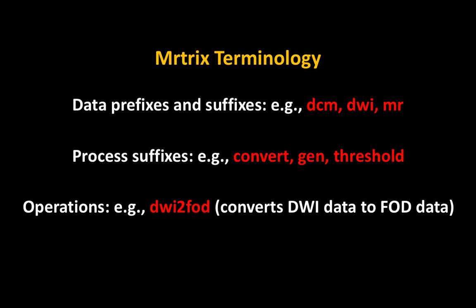You know the answer to run? Okay, that's fine. It converts MR data to another format. So typically, if you had something in NIfTI format, hey, that's the name of our organization. I just realized that. If you had something in neuroimaging, now I'm confused what that stands for. NIfTI, Neuroimaging Informatics Technology Initiative. Okay. That's a common extension for neuroimaging data. But MRtrix likes to work with its own extension, which is .mif, MRtrix format.